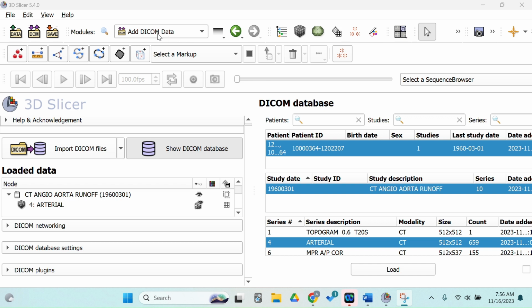Okay, so where we last left off, we had imported our DICOM file and selected the series we wanted to use. Now we are going to do two things in this video. We're going to crop the image to the part we're interested in. That will just help get rid of some excess anatomy, make it easier to edit, and most importantly, reduce the memory it needs to run.